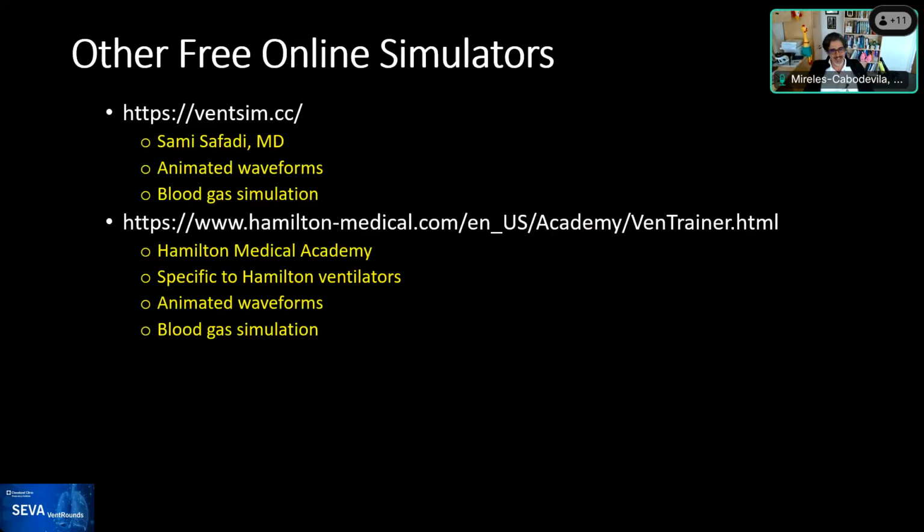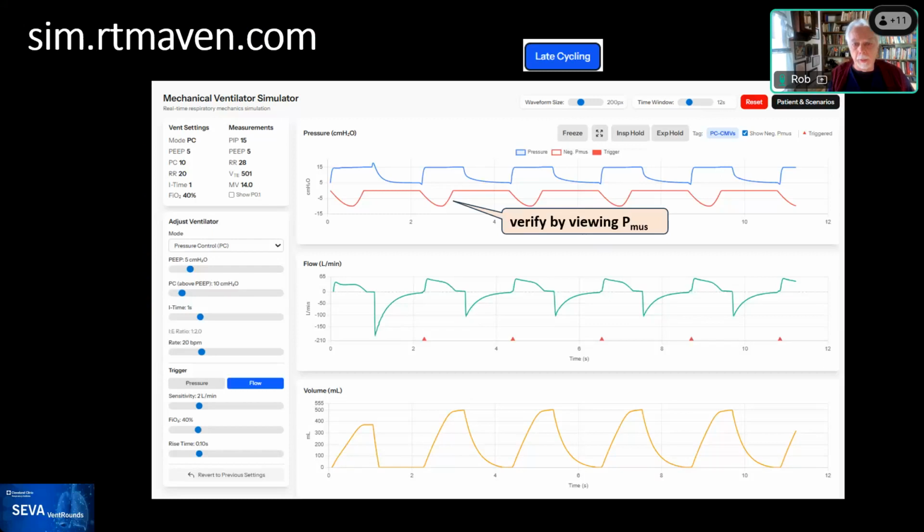Rob? No, that simulator is way simpler than this simulator. You can't do that. What you can do, however, is play around with the frequency so that the very first breath will start at zero time, but the next breath will start sometime after the first breath. So you can see it both ways. But the first breath always starts at time zero.